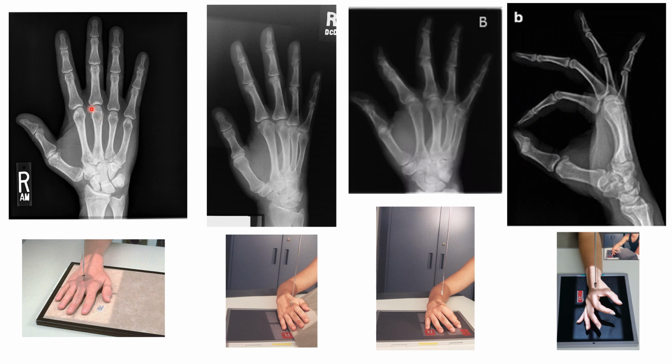So what we're looking for in our PA hand x-ray is for the phalanges to have the same concavity on both sides for each phalange. So we want to look at the phalanges here and notice the concave curvature on the sides, on the shaft of the phalanges.